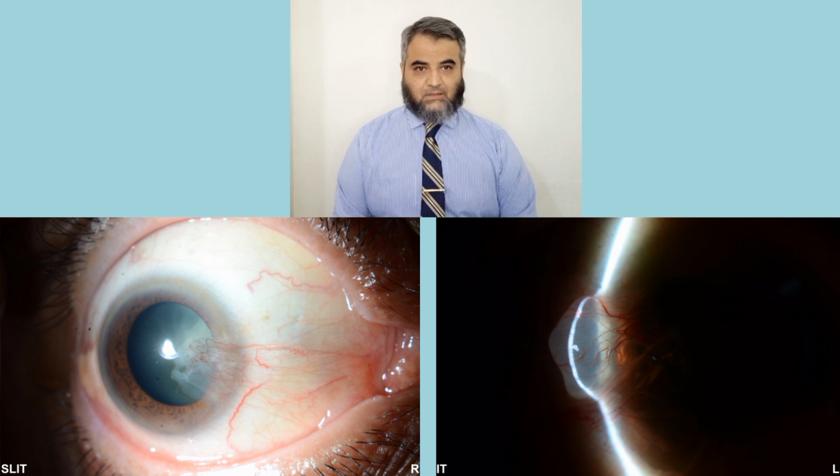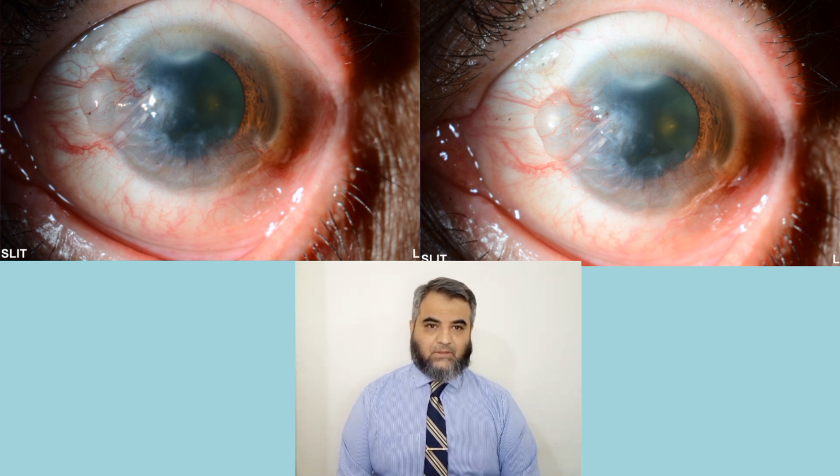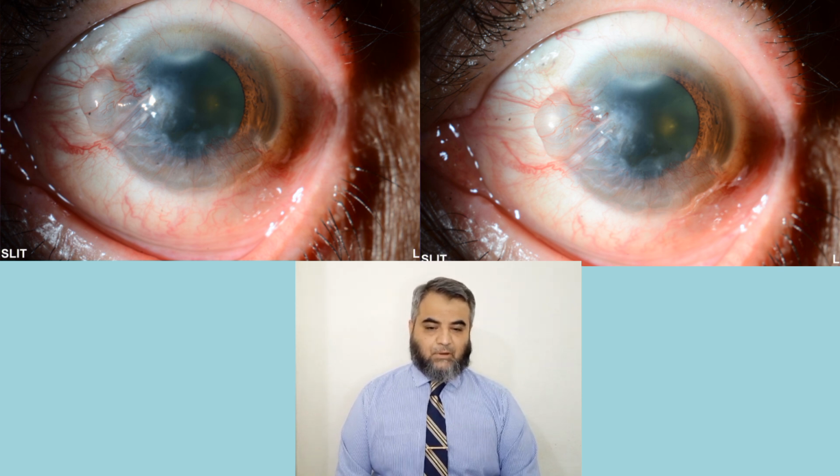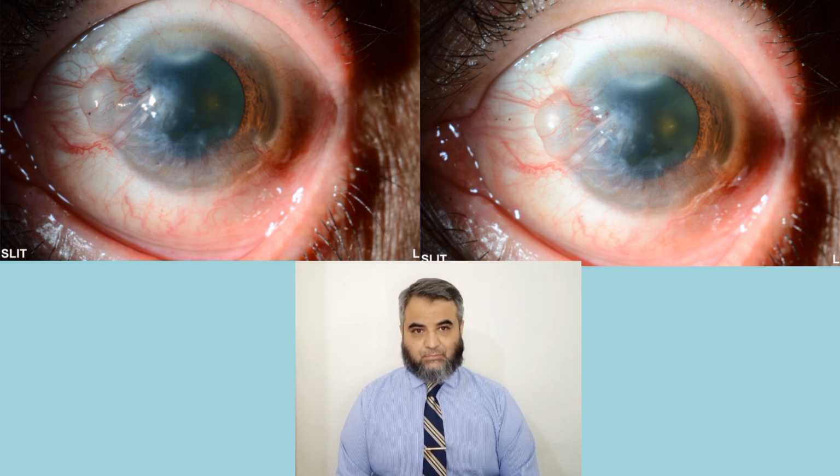But in the left, the photographer has taken a picture which is showing fluid. So there is a fluid present, which has been beautifully shown in the cross-sectional photograph. In these corneal photographs, you can see that the bullous appearance is on one side, nasally. But apart from this, it is also involving this fibrous growth inferiorly and to some extent superiorly. So this is an atypical presentation.